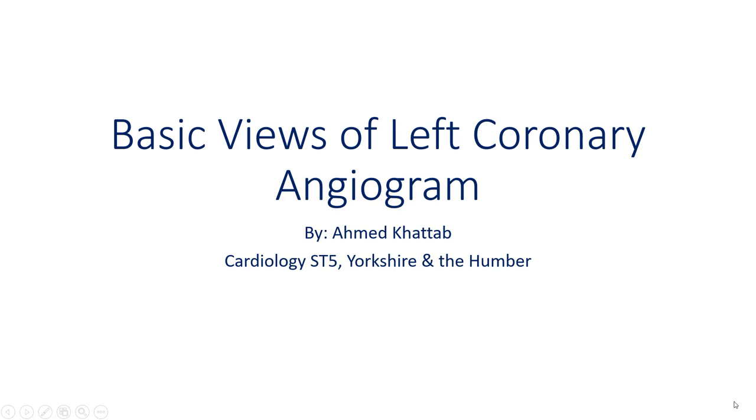Hello, this is a basic presentation about the basic views of the left coronary angiogram, and it's directed at SHOs and F1s to be able to identify the different views and which arteries are the LAD and which arteries are the left circumflex. It should not take longer than 15 minutes, and feel free to pause the video to take some time and think and imagine the arteries as we go along.